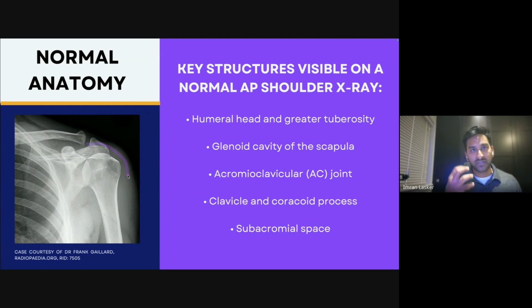It means there's fluid underneath those areas, but above the rotator cuff. So the rotator cuff muscles and tendons are here, then you've got your subdeltoid or subacromial fluid, and then you've got your deltoid muscle. That's important because when you do interventions like injections, you don't go all the way through. And this is where I find it really baffling sometimes. I don't hate on anyone, so don't take this the wrong way, but you'll find out some GP or an orthopod has done a needle injection to the shoulder and said, oh, put it into this subdeltoid space.